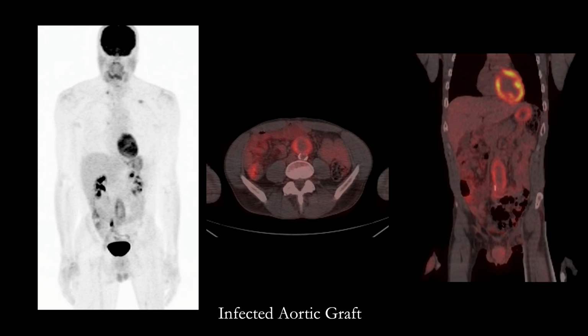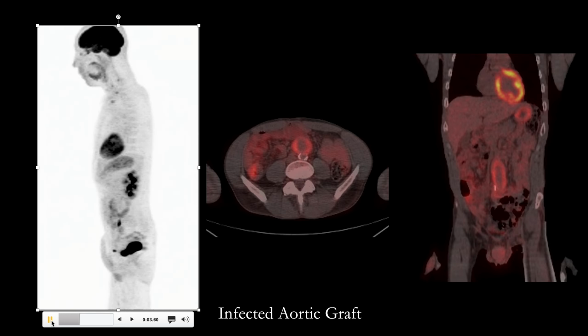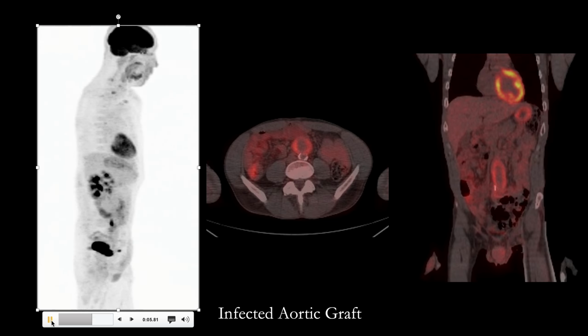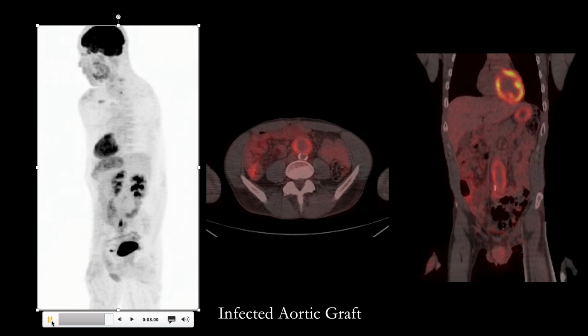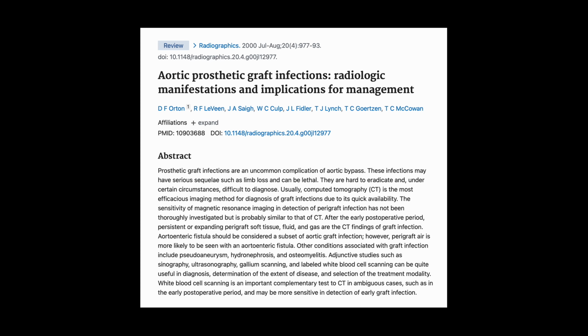Patient underwent a whole body FDG PET CT. Here is the rotating image, and we see mild to moderately intense FDG uptake at the site of abnormal findings on the CT. And so this is seen right here, the aortic graft with surrounding enhanced soft tissue and fluid. It is showing FDG uptake suggestive of an infected aortic graft. This is a good review paper on aortic prosthetic graft infections, radiologic manifestations, and implications for management.